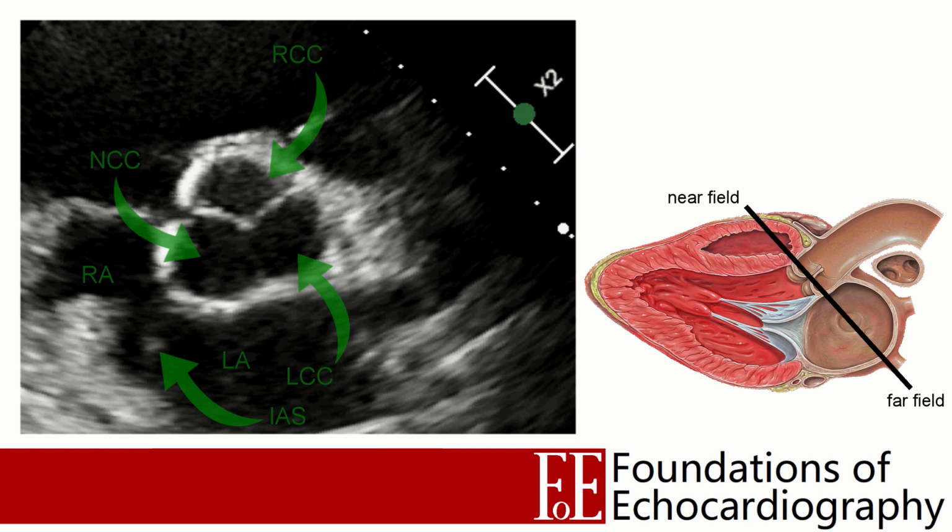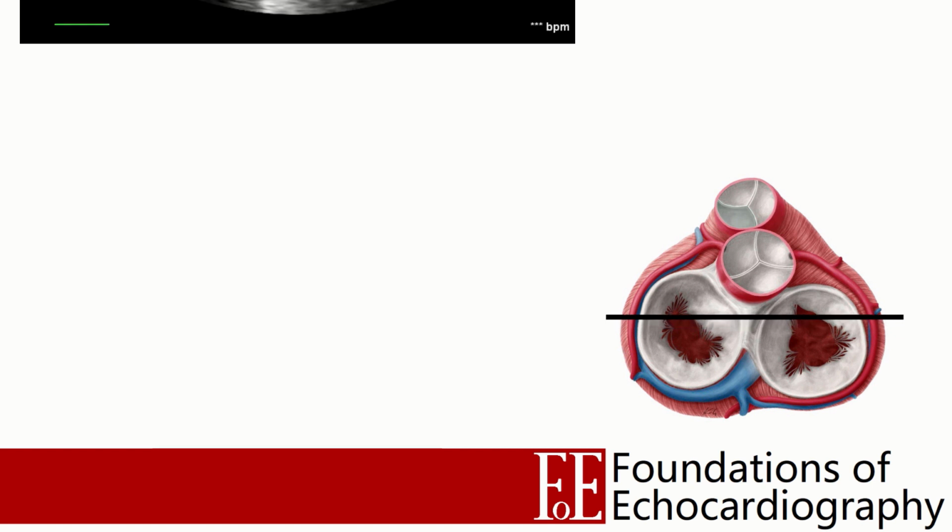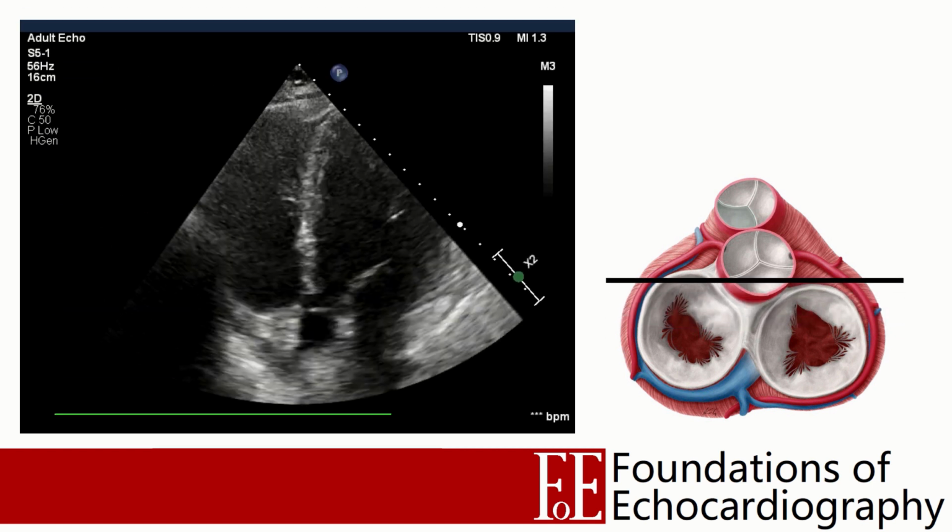you distinguish between the two is that the non-coronary cusp sits on the fence, where the fence here is the interatrial septum, clearly seen in this view. The third and final view in which we can see the aortic valve in the Level 1 minimum dataset is the apical 5-chamber view, and in terms of observing the aortic valve anatomy, this is probably the least useful.